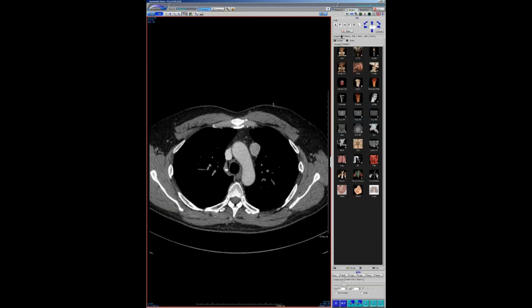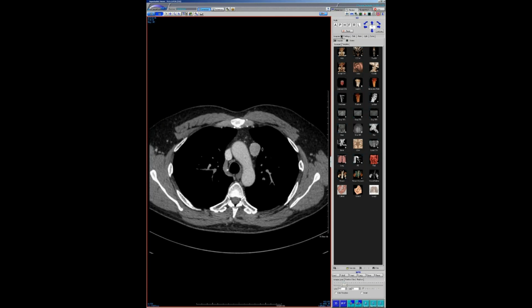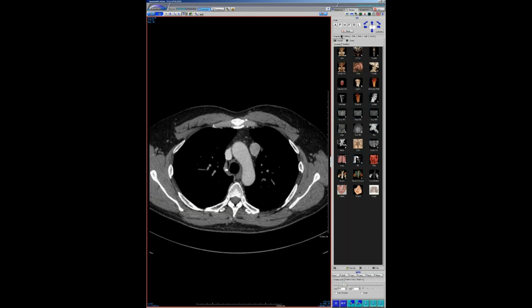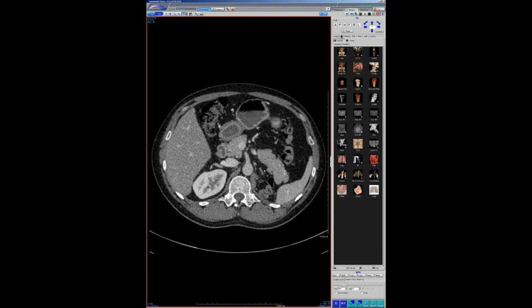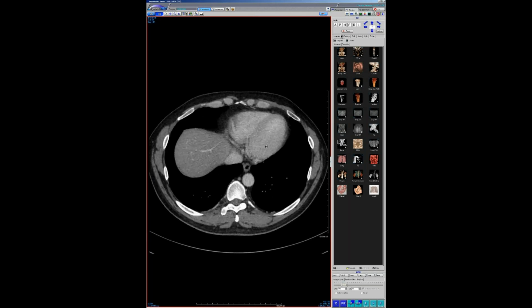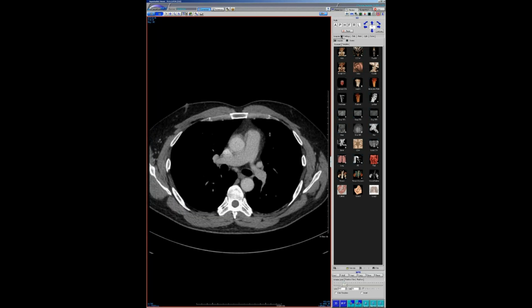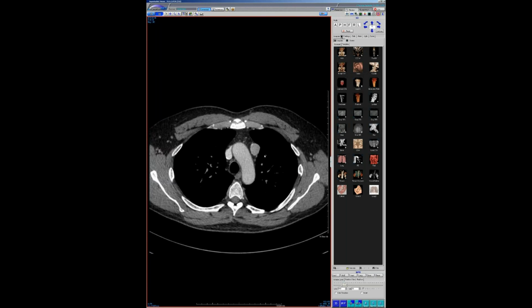He really didn't have any other findings on CT in the chest. But with the little surrounding lip, normally I would think, this guy's like 50 or 55, it's just a thymoma. A little bit of enhancing nodularity, but he's missing a kidney, and he had no other mets anywhere else. This was biopsied and actually resected, and it was a renal cell met, just a solitary renal cell met to the anterior mediastinum.